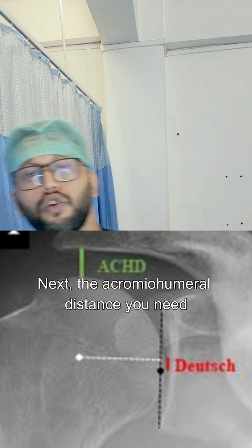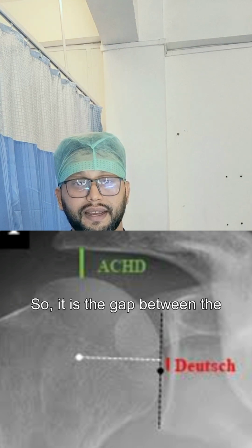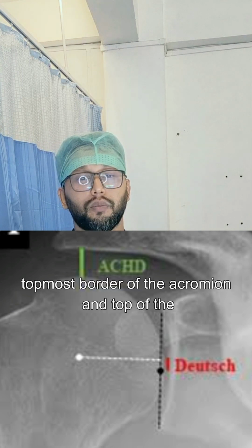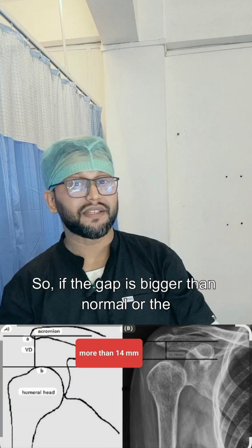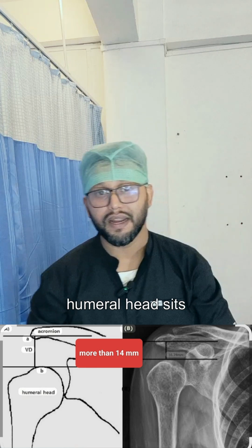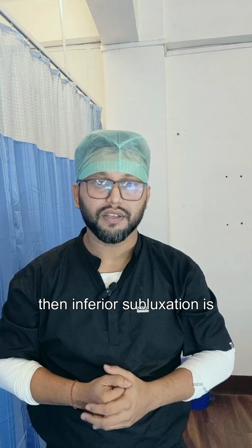Next, you need to find the acromiohumeral distance. It is the gap between the topmost border of the acromion and the top of the humeral head. If the gap is bigger than normal or the humeral head sits below the socket, then inferior subluxation is confirmed.